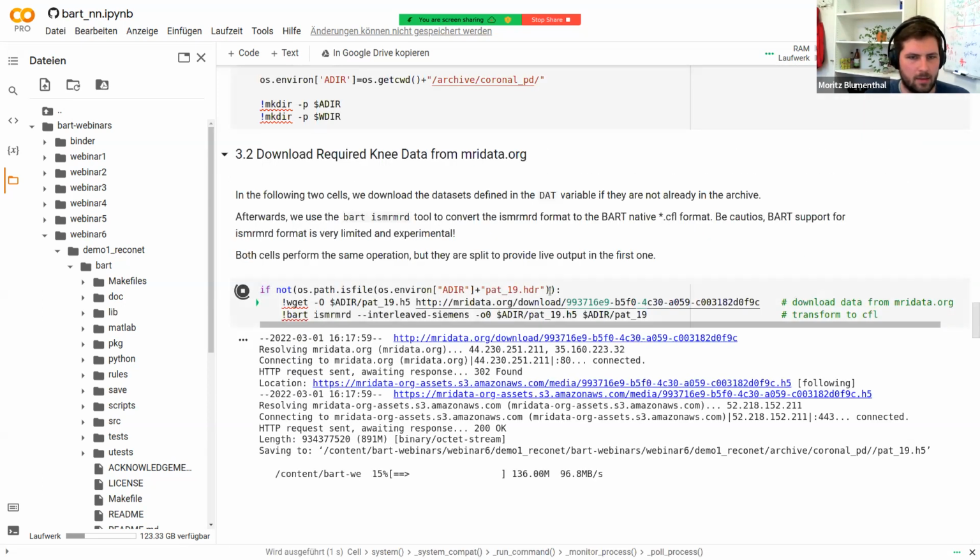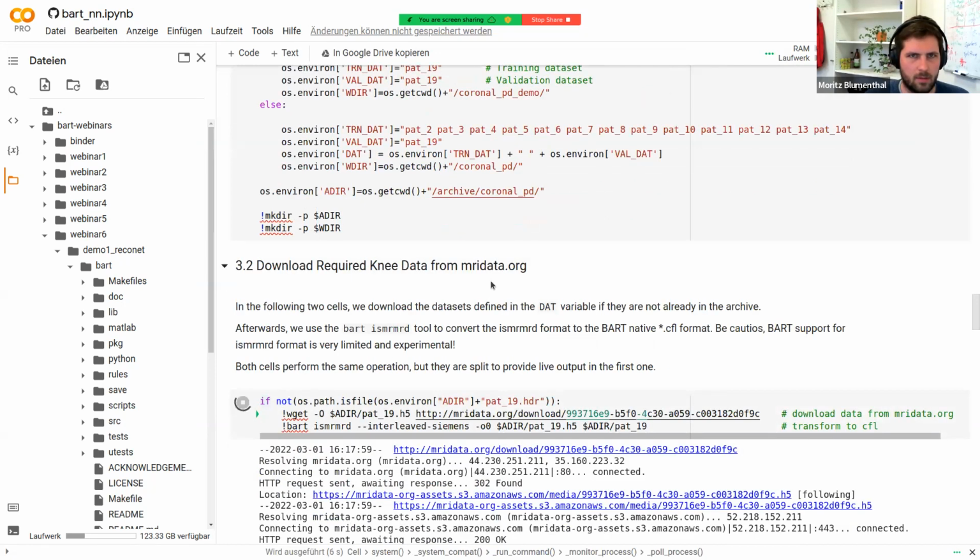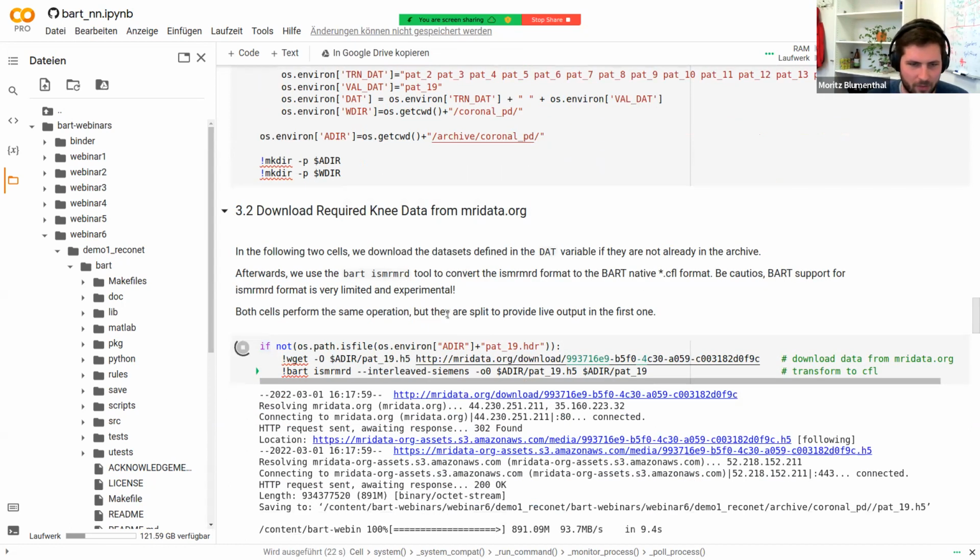Sorry, but when you got the message about GPU or standard, which did you select? Keep the GPU. Don't switch to standard, because then everything will be slow or fail because we tell BART to use the GPU. The setup takes some time where we don't use the GPU, so Google asks you to switch to CPU if you don't need it.